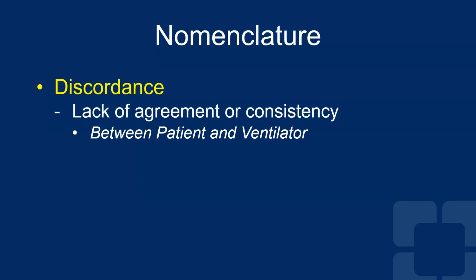And then we're going to describe in order the patient ventilator interaction, starting by trigger, inspiration, cycle, expiration, and then we look at some volume and patterns. All of this has been described in this paper in Respiratory Care, which you can use the QR code to find, and it goes more in detail. For the sake of this survey, we cannot go and describe everything in detail.